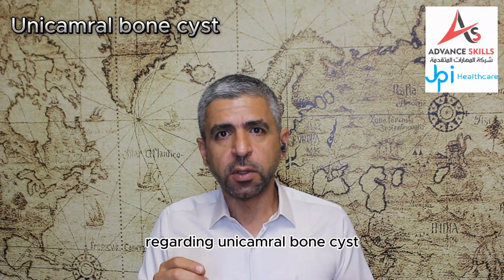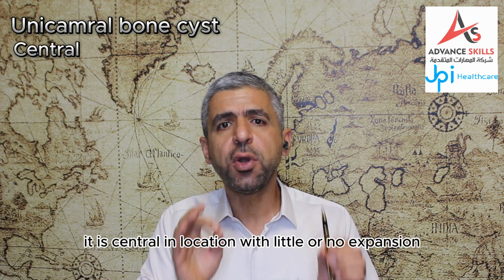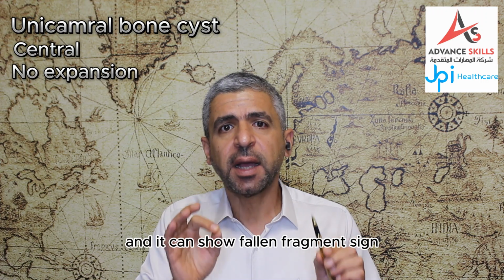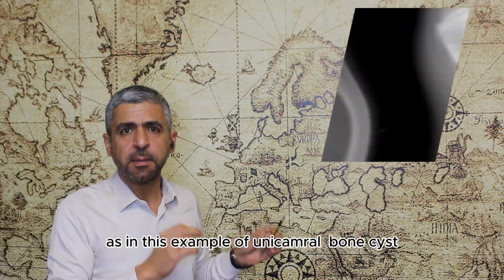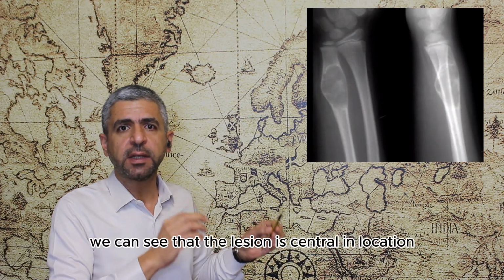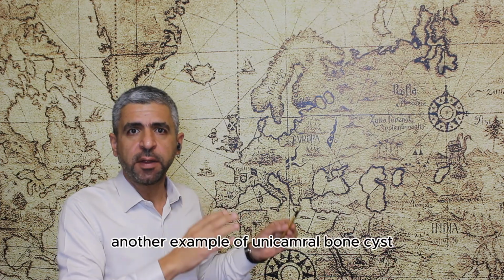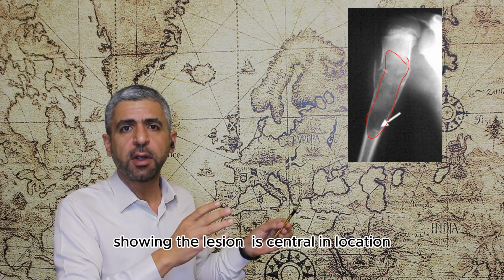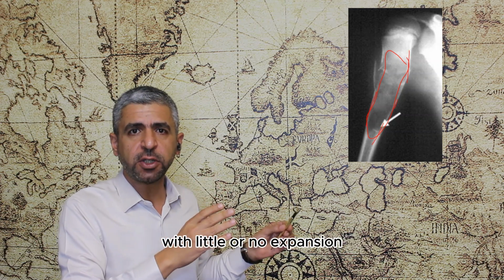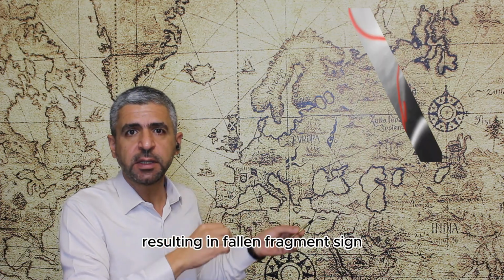Regarding unicameral bone cyst, it is central in location with little or no expansion, and it can show fallen fragment sign in cases of fracture. As in this example of unicameral bone cyst, we can see that the lesion is central in location with little expansion. Another example of unicameral bone cyst showing the lesion is central in location with little or no expansion and a pathologic fracture resulting in fallen fragment sign.